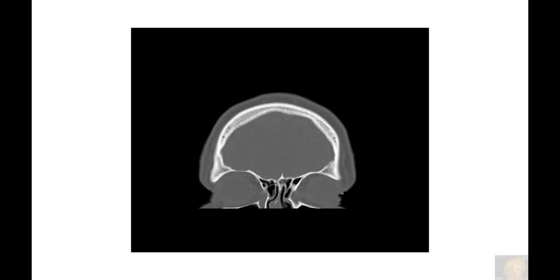So here we can see a bony tube coming from the medial side, towards the center part of the orbit, that drains the tear that's produced in the lateral superior part, washes the eye, and drains through this nasolacrimal duct. So when you are crying, the tear is made here and drains into the nose, and you have to blow your nose.